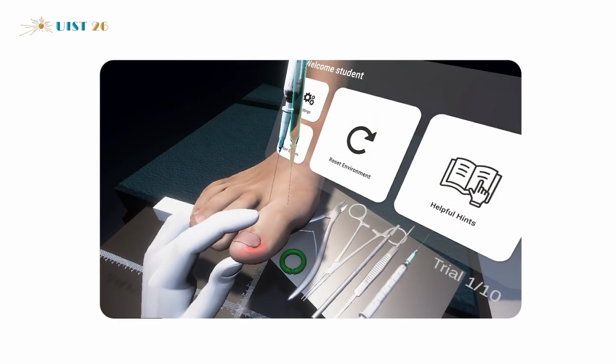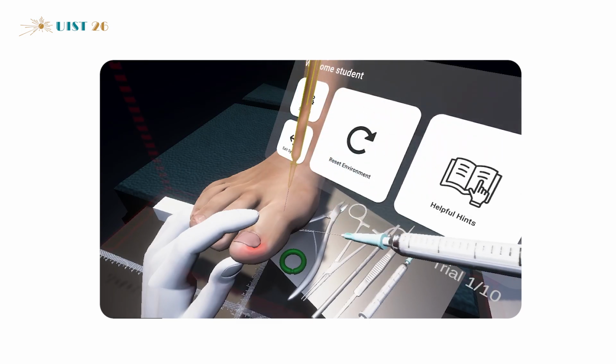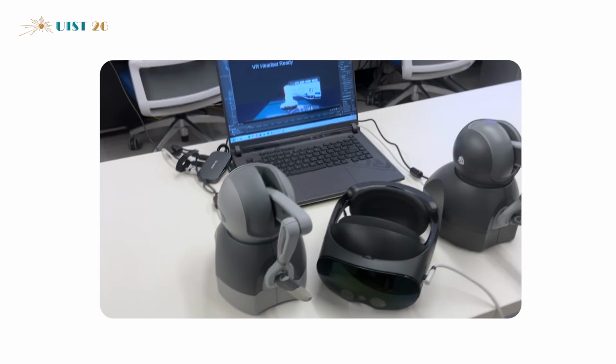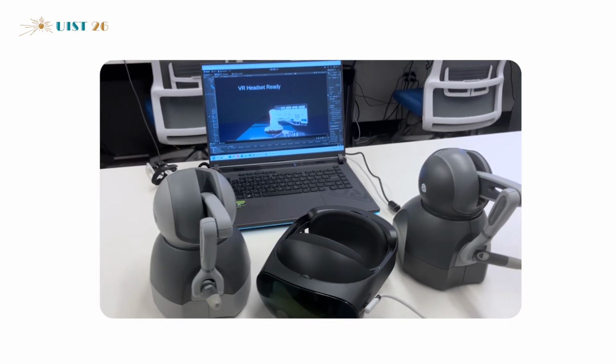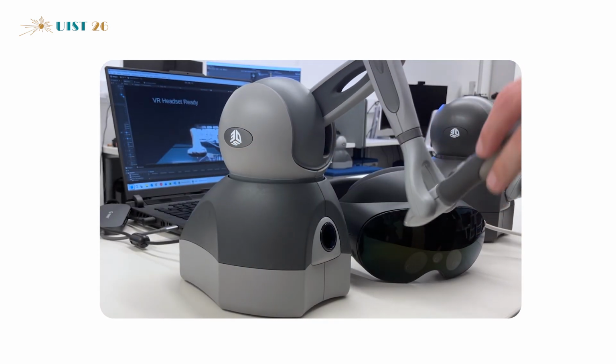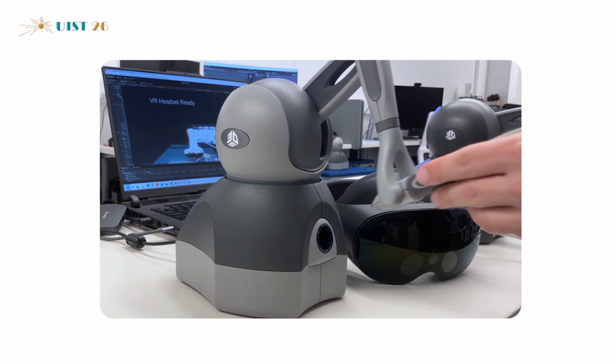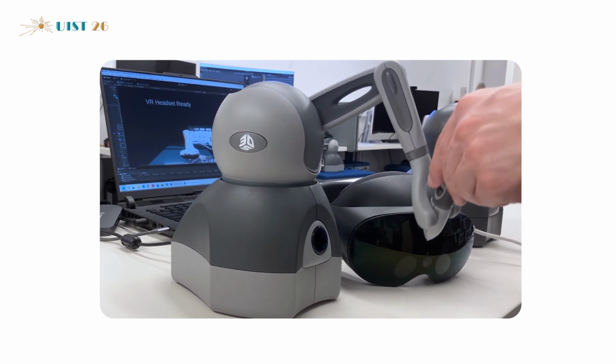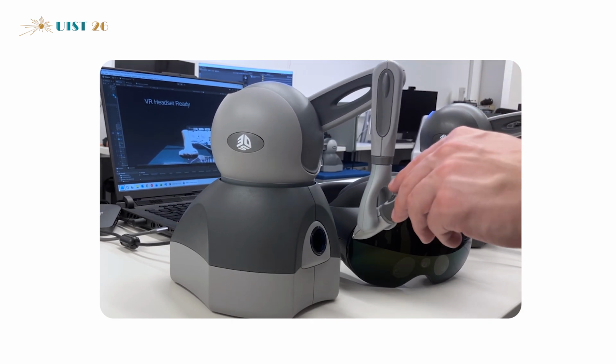Beyond training itself, virtual simulation environments create opportunities for advanced analysis of kinematic surgical motion. In this work, we study a VR ingrown toenail removal simulator with dual haptic devices that captures multimodal surgical behavior, including hand position, surgical tool angle, force feedback, and button press events.